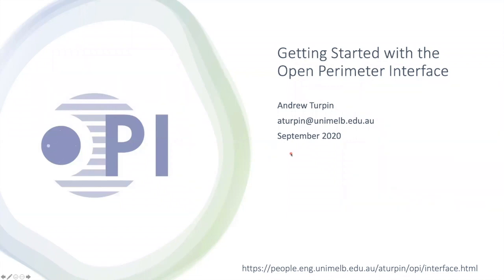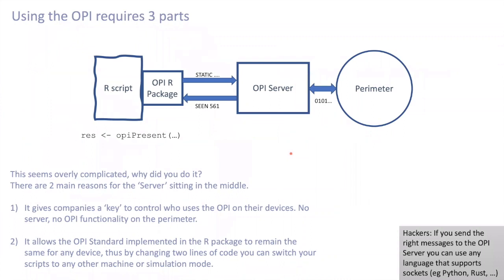Welcome to the introductory video for getting started with the Open Perimeter Interface. So the OPI interface consists of three parts. There's the R script that you write, which will make use of the R package. There's a thing called the OPI server, and finally there's the perimeter itself.